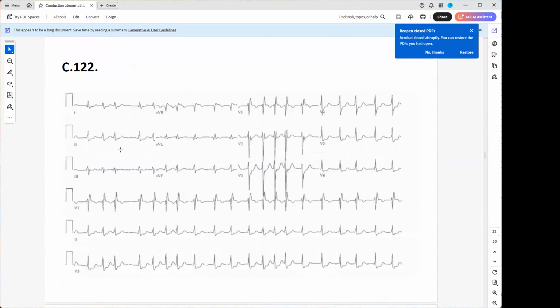At first glance, it looks fairly rhythmic. This is rhythmic. No, I mean not really, because it's barely rhythmic.